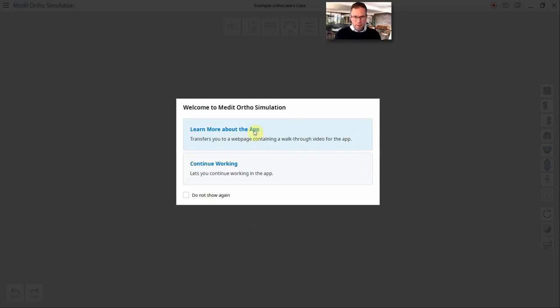You can learn more about this if you click on this button here. It will take you to the Medit website. You can download the example cases, and there are some other training or full training videos. So this is just a first look.